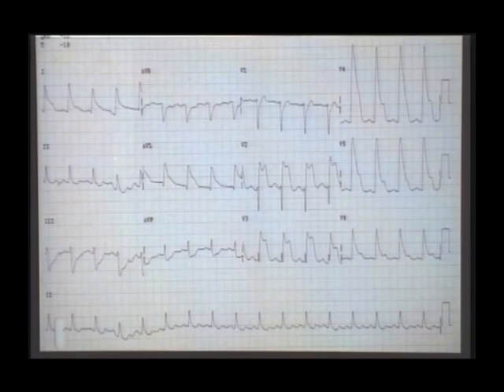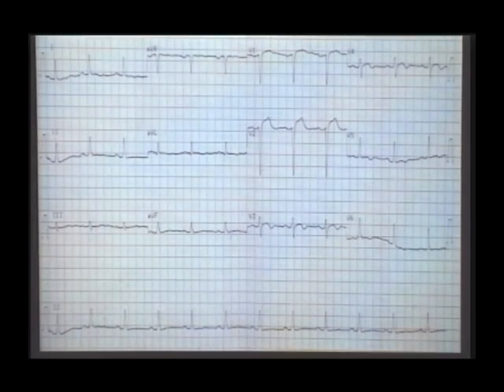So you can see a huge ST elevation MI. What's happening here? The huge ST elevation in V1 to V6, L1 and aVL means the entire anterior wall, interventricular septum, anterolateral wall and high lateral wall are injured. The entire left ventricular myocardium is going to die in this patient. But at this point in time, see the R wave there. That means there is no infarct at this time. So you thrombolyze the patient within 30 minutes or 15 minutes of entry into the hospital.